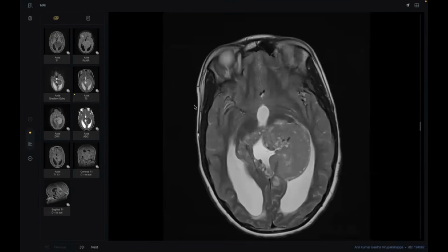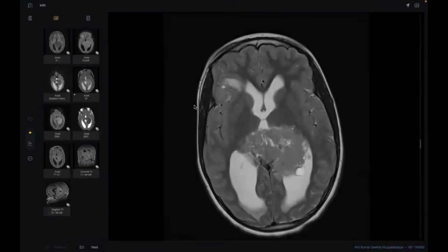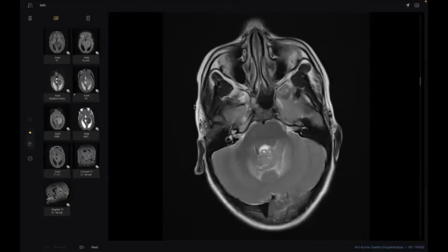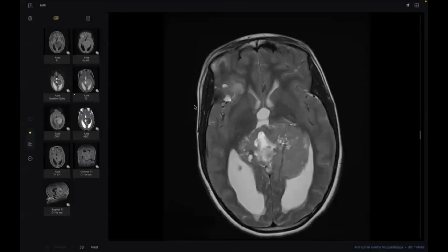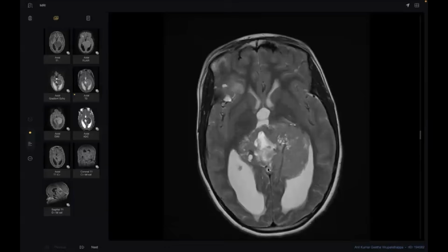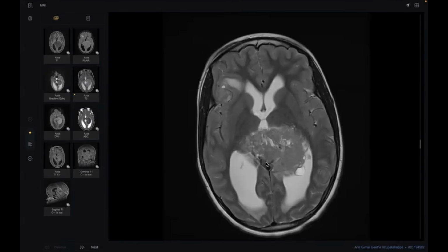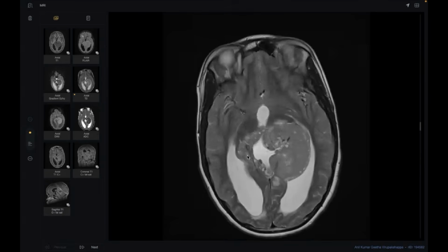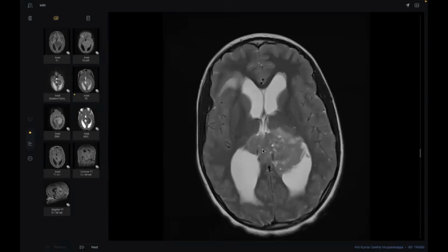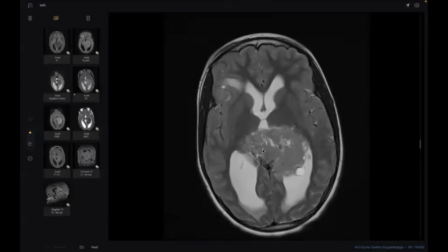See, look here. The brainstem is quite distorted as well due to this massive lesion. Where is the main center? See, this is the vein of Galen. These are both internal cerebral veins. Why are the veins markedly displaced and infiltrated? What does it mean for you?